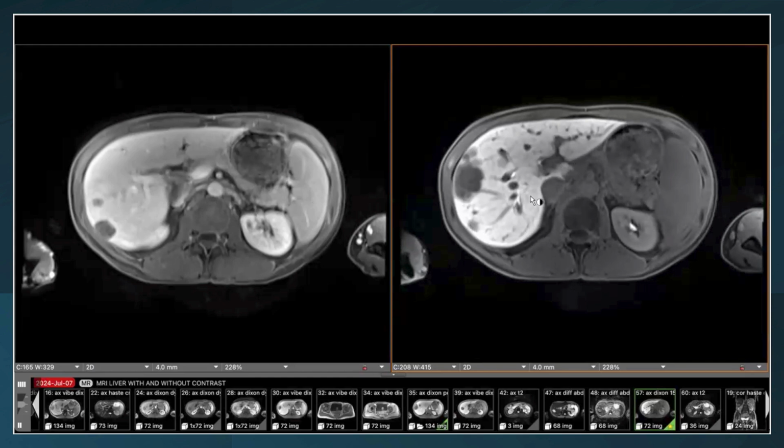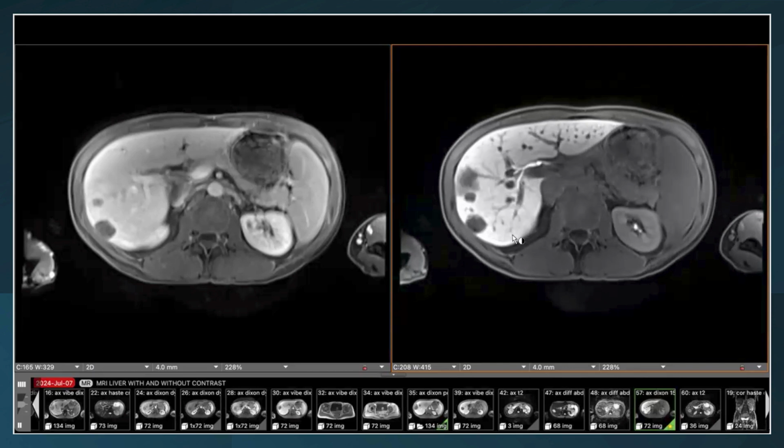The liver parenchyma is quite bright, and that's because of the timing of the contrast agent. And as we talked about in the previous case, how we know we're in the hepatobiliary phase of imaging is the presence of bright signal inside the liver, as well as excreted contrast through the biliary system. And that's what we see here. It's really important when you're doing EOVIST examinations to understand what phases you're in, because that will help you with both lesion characterization and detection.